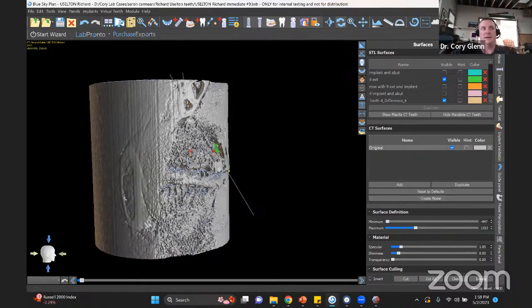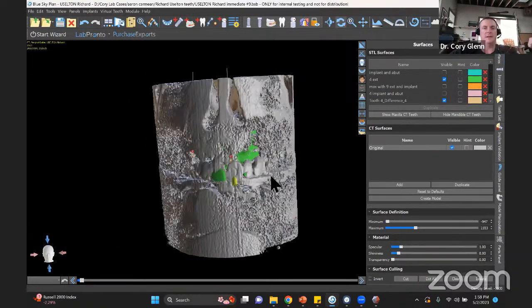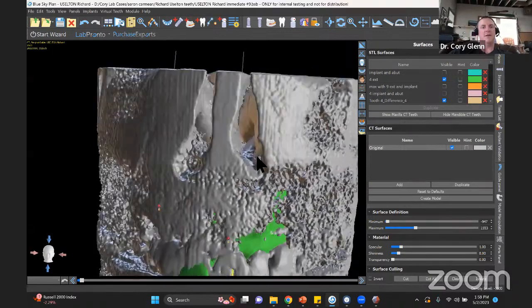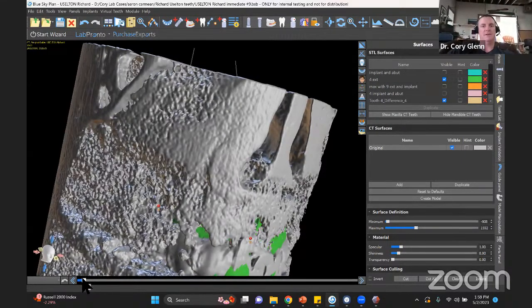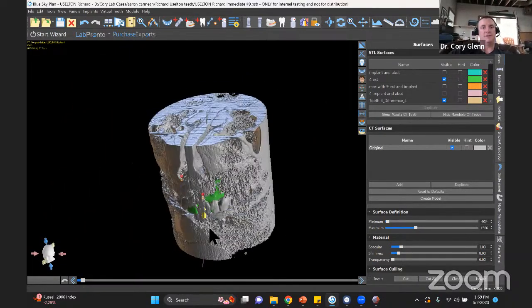And now you have an STL of the skin. So I would think, Michael, that's probably something we could automate pretty easily if we just put it in the development pipeline. But this is the only piece of soft tissue that's showing, but do you see how the nose, the inside of the nostrils and everything, this is all soft tissue? Do you see how that renders really nicely? So just play with your slider until that renders and then hit create model, and there's your soft tissue scan.